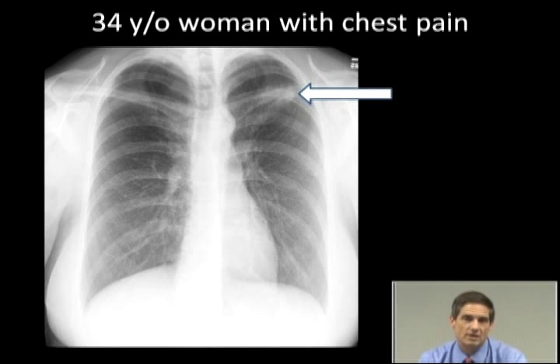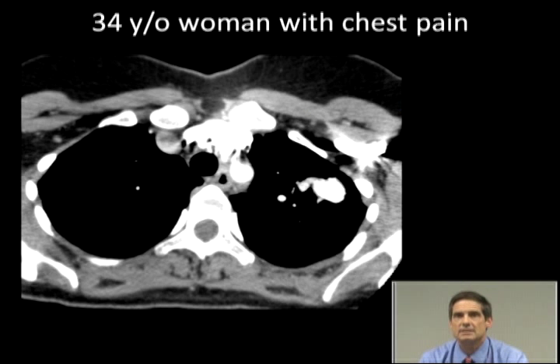Now, in a 34-year-old woman, it's very unusual for a cancer to develop, and it's very unusual for a cancer to cause pain as a pulmonary mass unless it's eating into the pleural space or a rib or something. So the next step, of course, when you see something like this is to get a CT to find out exactly what's going on. In this case, the CT showed this lesion in the left upper lobe, marked by the arrow here, and note that that lesion shows the same density on this contrast-enhanced study as does the vascular tree. This is an intensely enhancing, completely vascular lesion.